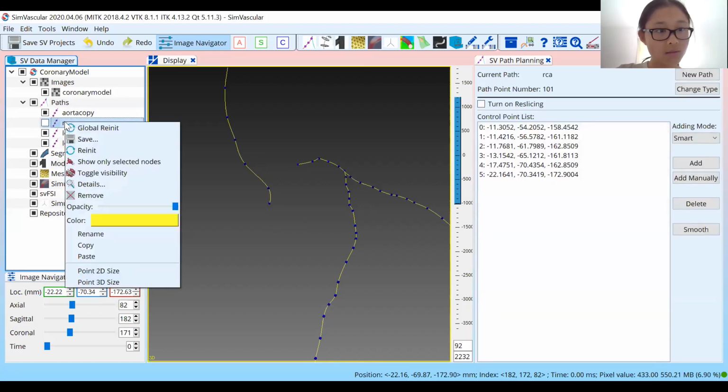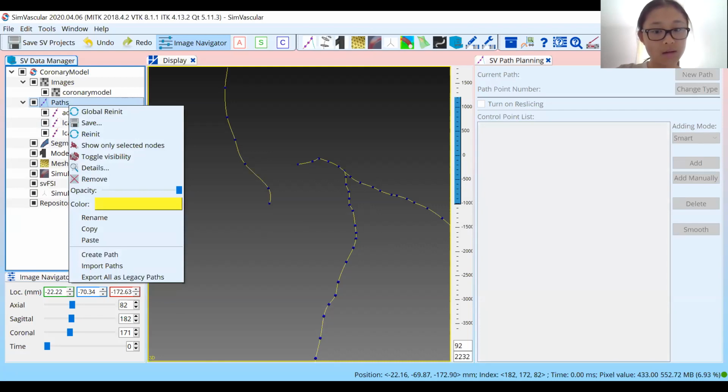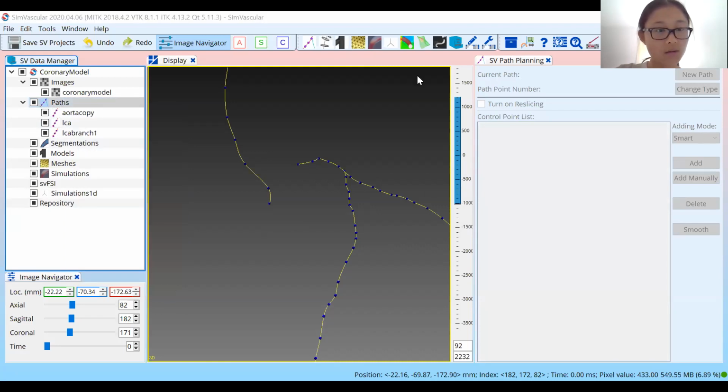And this one as well. All right, so I'm going to continue importing in. And I'm actually going to do a new share because I don't think you could see those pop-ups that were appearing.